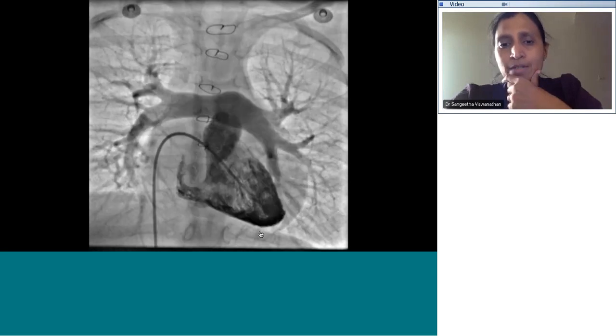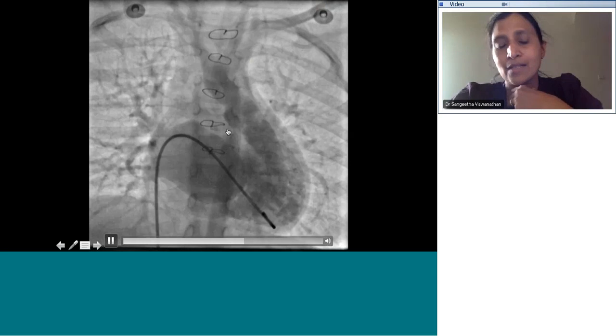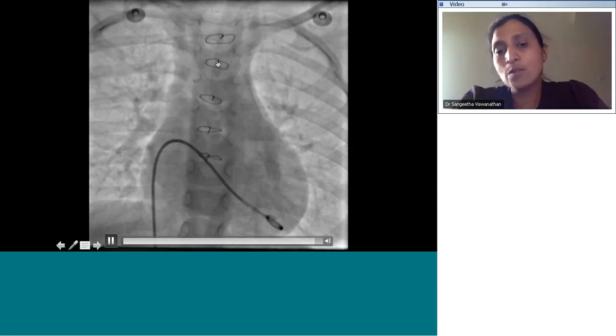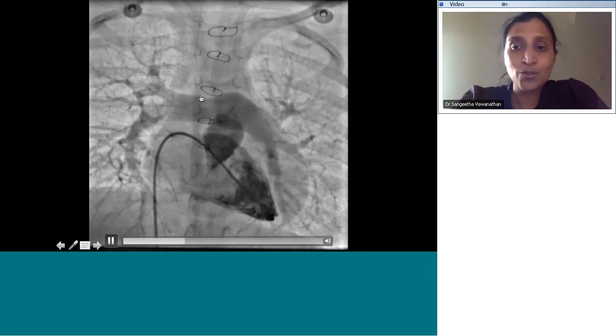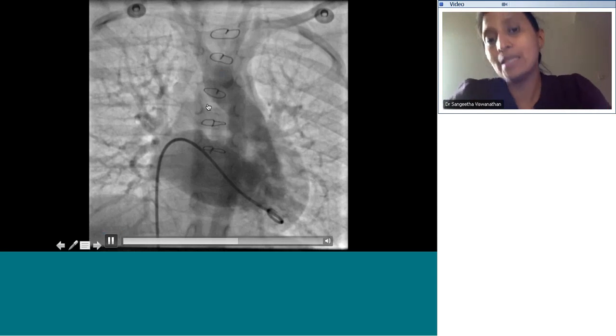No, it's not an atrial switch. The RA is still connected to the LV. Correct. So it's a PA band. So this patient is being prepared for a double switch operation. Has sternotomy. So it's important to notice all these things. Just saying this is CTGA is an incomplete answer.